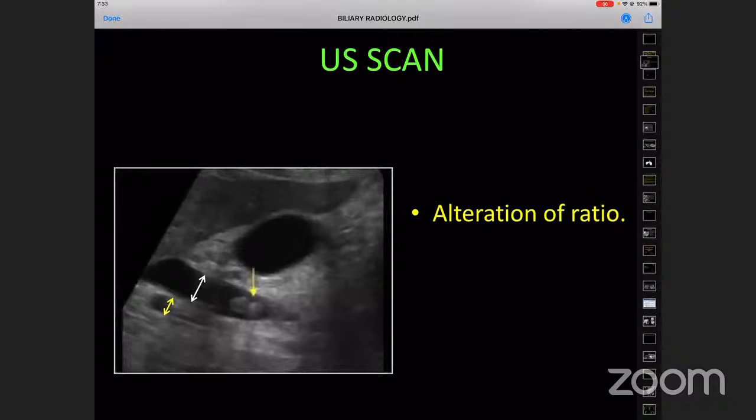Anywhere in our body, a stone will be echogenic, and it will give a posterior acoustic shadow. Only sometimes in the gallbladder, when we see a large ball or soft calculus, we see an echogenic lesion which is mobile but not giving a posterior acoustic shadow. We call it either a soft calculus, a forming calculus, or a sludge ball. Apart from that, any renal calculus, ureteric calculus, or CBD calculus should be a round to oval echogenic lesion that would give a posterior acoustic shadow.